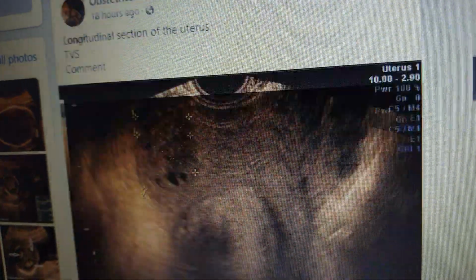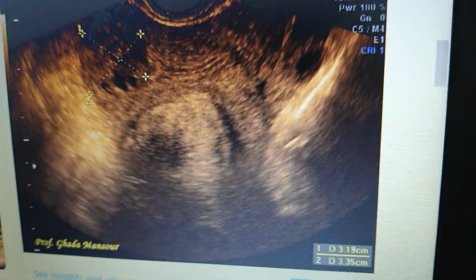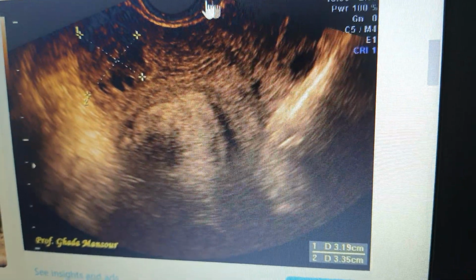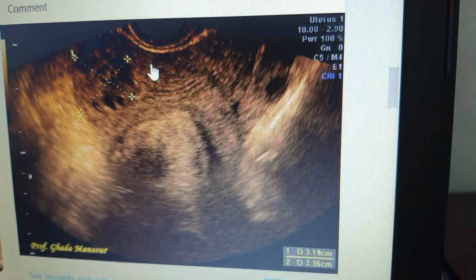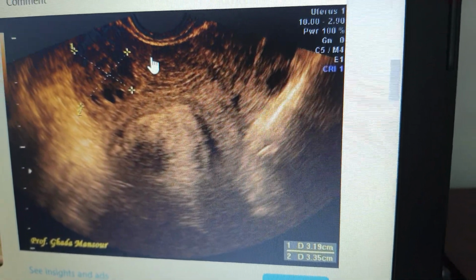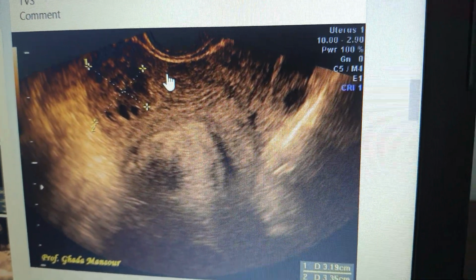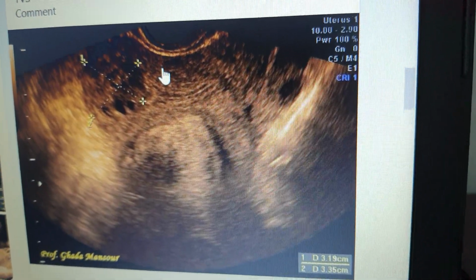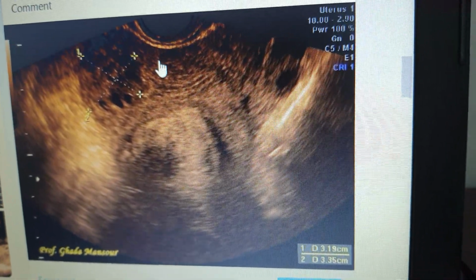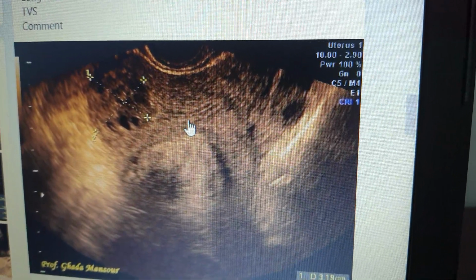But the other picture, in which actually I was not convinced, and I didn't like those who said that this is an ovary. That's not a good perception. That's why I publish these pictures, and I'm giving you time to think about these live quizzes, and then I discuss it with you again. I noticed that when I just write the answers and discuss them like answers, you need to listen to me explain the false impression or the false diagnosis.